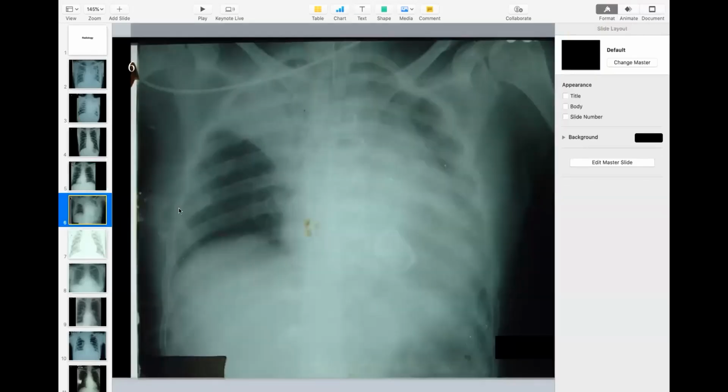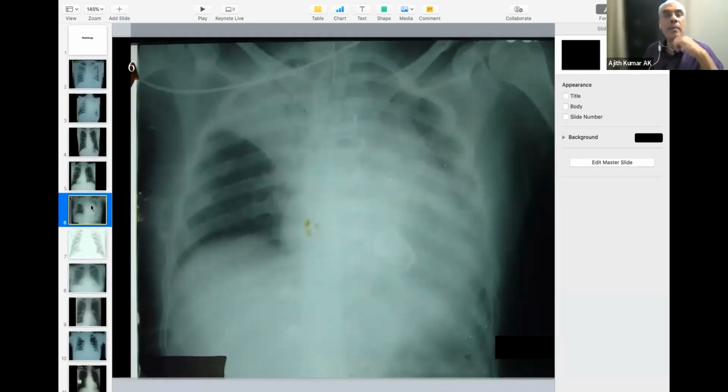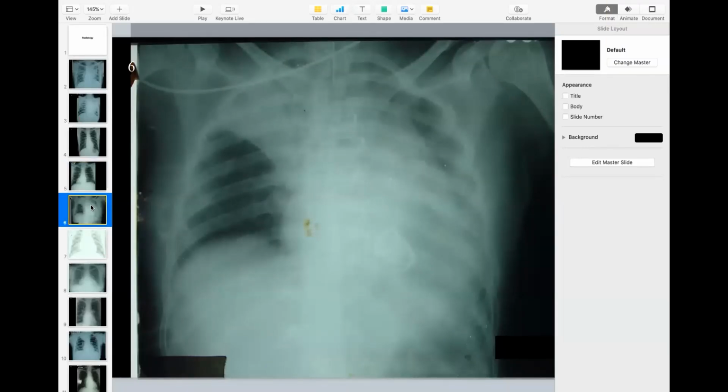We'll just ask candidates to describe one or two. Please, this one. Yeah, please. Somebody, please see if you can read the X-ray, please. We'll try 2 or 3 X-rays for the participant reading.